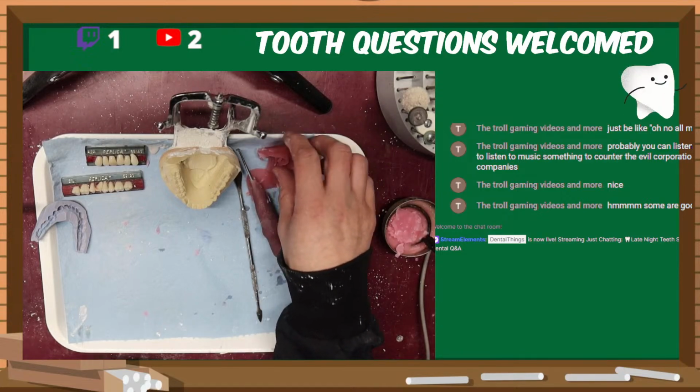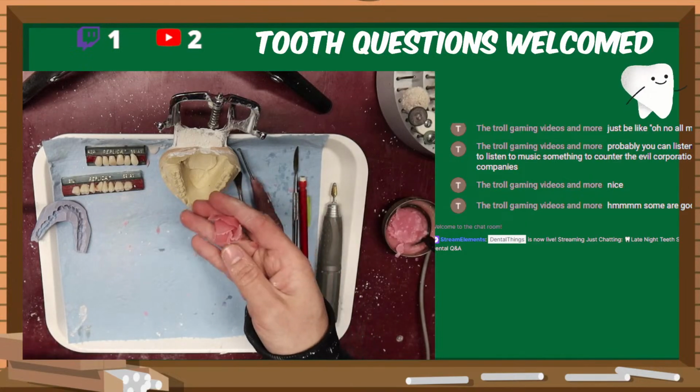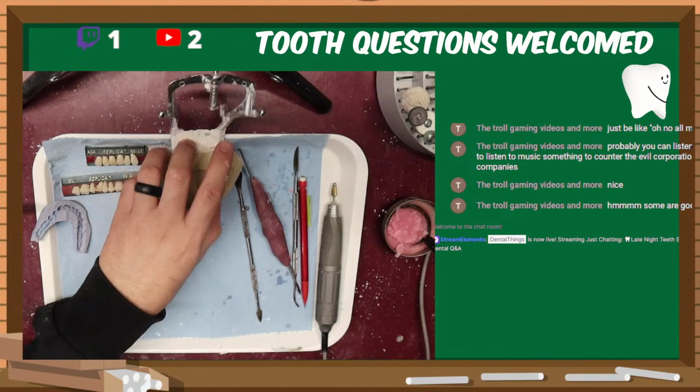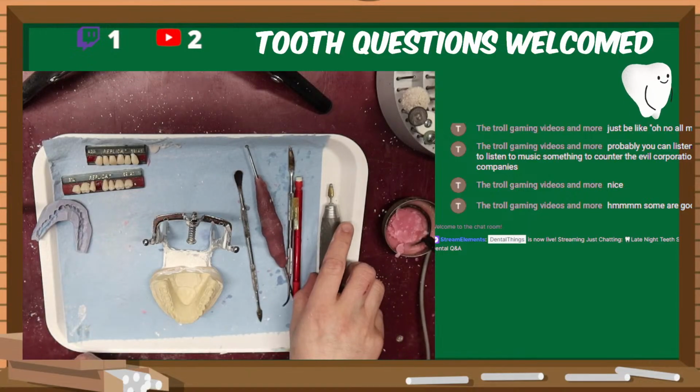And then I know I promised I wouldn't destroy these. I'm going to go and do just a few of them. Firing at the moment. And these are 31s, and I know this one is a bigger or a wider one.